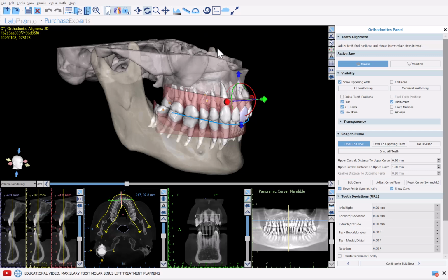It also points out the relevant new features and functionality, including the ability to add teeth, delete teeth, completely automatic segment the CT teeth, the bone, the airways, and it talks about the advantages of using the true anatomical mechanics, the full patient anatomy when designing the digital aligner tooth setup, and its effects on reducing and eliminating mid-course refinement cases. This video will focus on the aligner digital tooth setup, controlling the teeth movements, and all the new features and functionalities that we have connected to that.